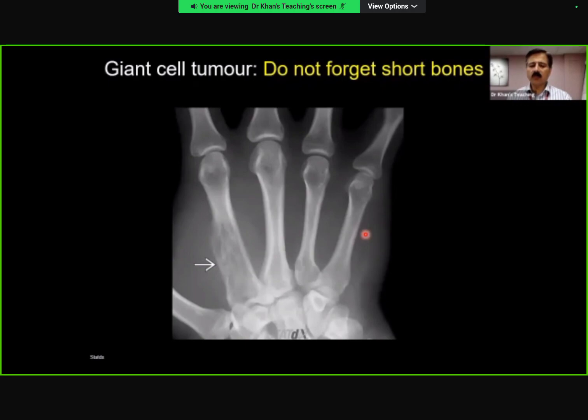So if you have got something like this, you remember in the previous chapter we did enchondromas. So with enchondromas, you can have giant cell tumor, as this example tells you. You can have simple bone cyst, you can have osteoid osteomas, you can have aneurysmal bone cyst, you can have brown tumors, you can have fibrous dysplasia. All of these things can occur. So keep your minds open, and the differential diagnosis will be based on other parameters like age and other associated things which you know.